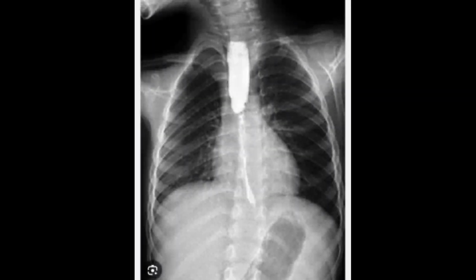Have a look at this barium study. You will be able to appreciate a long smooth wall stricture, mostly involving the mid and lower esophagus. That is because of the prolonged NG tube, and this is because of the inflammatory response secondary to the foreign body within the esophageal lumen. So you need to have the patient's history with you, and the patient might be on the NG tube for quite a long time. So this is a clear example of an iatrogenic benign esophageal stricture.